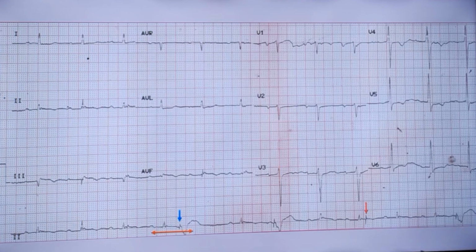We will not be very sure about associated pacing function abnormality, and we are in fact seeing some paced QRS complexes. When the lead is floating, it can touch the myocardium or not touch the myocardium, and even without touching it, if it is near, the voltage given to the signal may be high enough to cause capture.